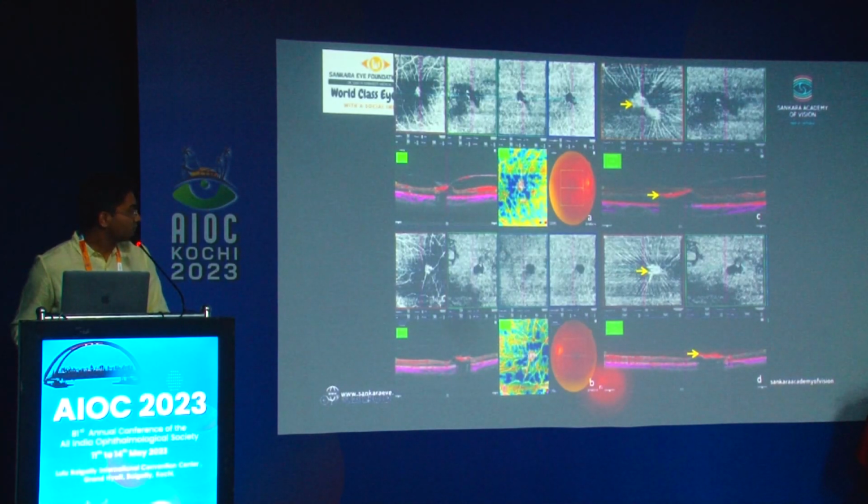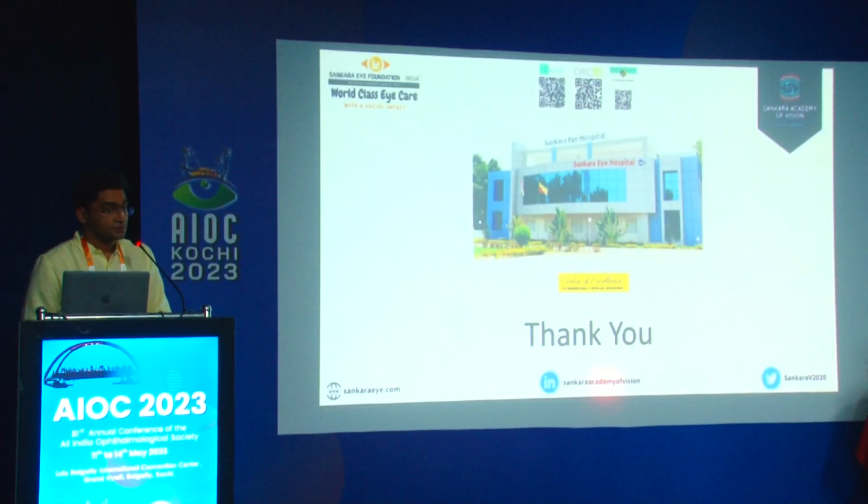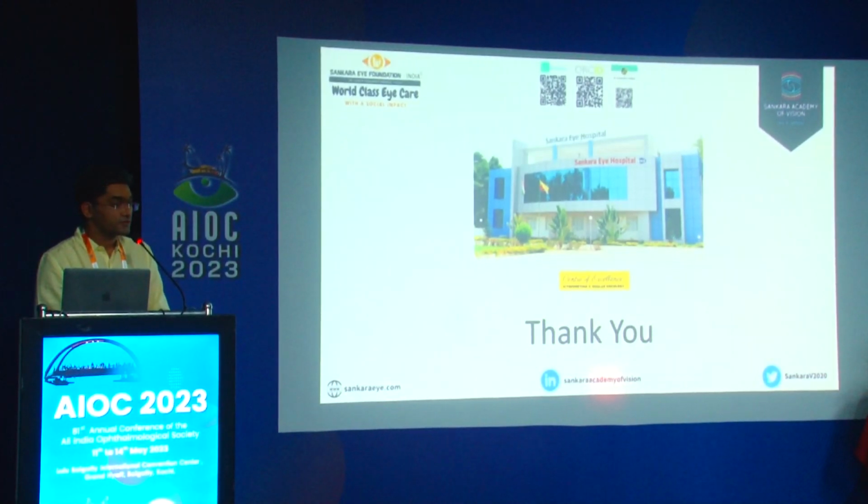These are cases where the patient was having proliferative diabetic retinopathy. So we are not sure whether the neovascularization is primarily because of the diabetic retinopathy at the fovea, or probably with this we had published before. So thank you, and we would be open for discussion.